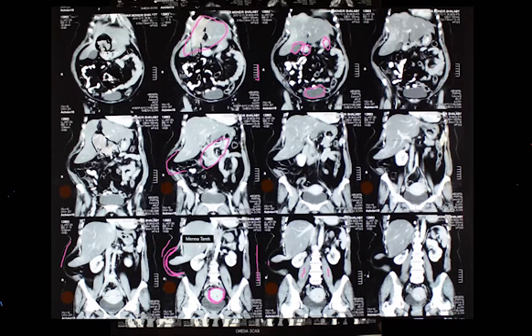Where are the vena cava and the aorta? Stay on the film you marked. So this is the hernia. Where is this hernia located, do you think? Lumbar. Bravo. This is a lumbar hernia. It may be an incisional one. A lumbar hernia develops from the absolute back, in the area of the lumbar triangle.